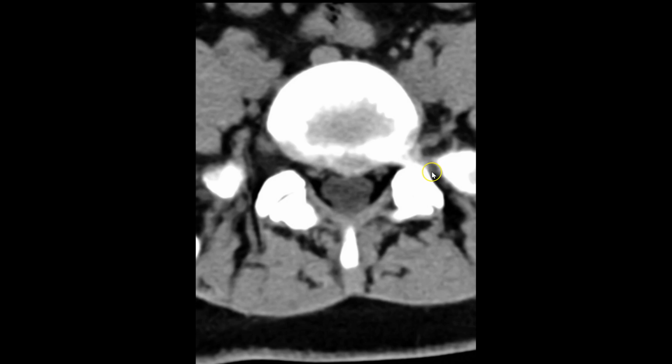This lecture has emphasized mostly MR imaging of disc pathology, but I do want to say CT is pretty good for evaluating disc pathology. It's not as good as MRI, but it's pretty good if your patients can't get an MRI for some reason, say they have claustrophobia, or they have a non-compatible pacemaker, or aneurysm clip, or some other reason, or if there's metal artifact that you have to work around. CT can be really helpful, and one of the main reasons is because of the contrast between fat density, which is dark black, and then soft tissue density. Because of the epidural fat, we get a nice interface between disc material, epidural fat, and the thecal sac.